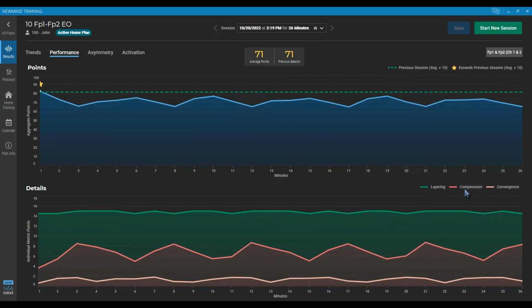The next thing we're looking at is compression. A lot of times the protocols we're choosing to train our clients, generally they're going to have some slow wave frequency coming down with an increase. You'll always have an increase of mid beta in the left side. That's all 24 of our protocols are designed that way. That's always just to keep that left hemisphere running faster than the right, keep them out of an anxiety state. And then we're either normally bringing up an alpha or a low beta.